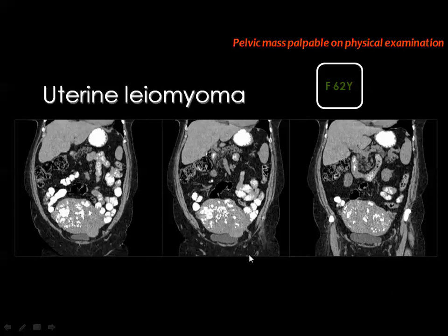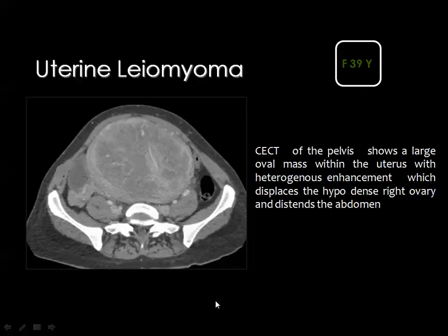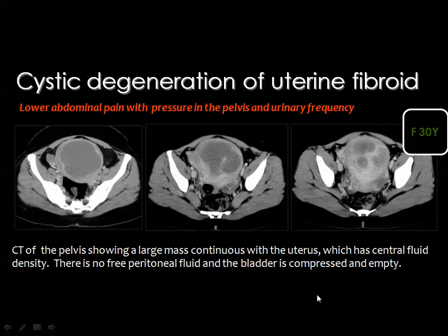And this is a very big uterine fibroid which contains a lot of dystrophic calcifications, as you can see. Then this is the fibroid uterus. Within the fibroid mass, or within the myoma, you can see hypodensities, and these are due to some kind of degeneration within the fibroid, including cystic and hyaline degeneration, and also there may be fatty degeneration within the uterine myoma.